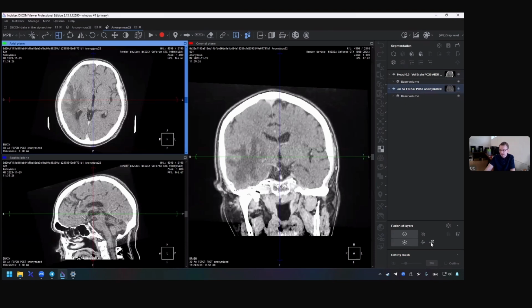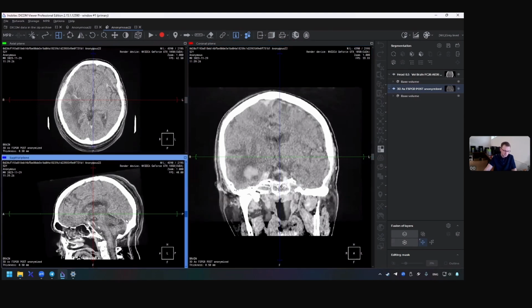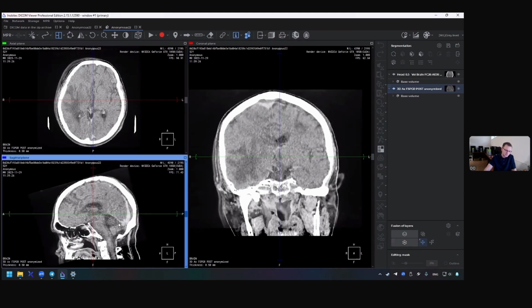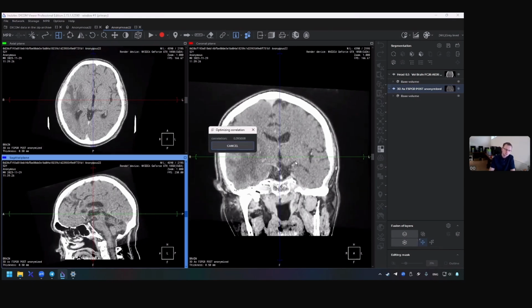But in some cases, it is needed to give a little help to the program by making a manual layer fusion a little. You can move this layer. You can rotate this layer pressing Alt. And after that, next time, click Merge Layers automatically and correlate it. Okay.